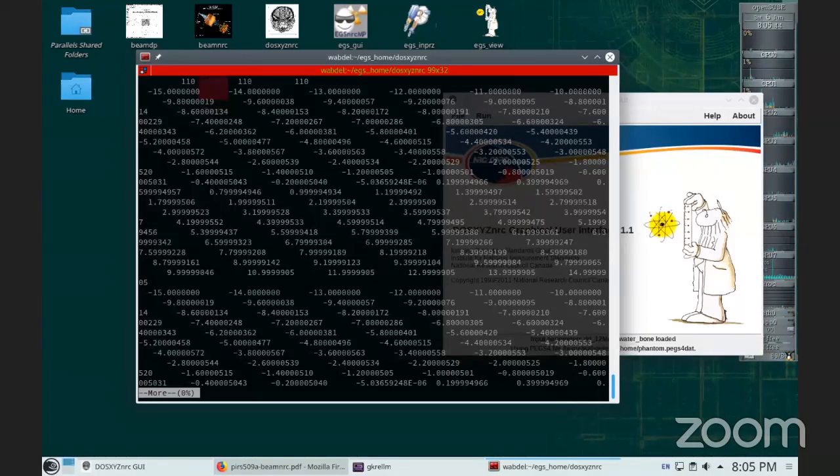It should run. Or you type dose XYZ _show. That one should also work. You type these commands when you are in the dose XYZ directory. Don't type it in a different directory, because by default it scans the directory that you launch this application in, and it will see whether you have a 3D dose file or not.